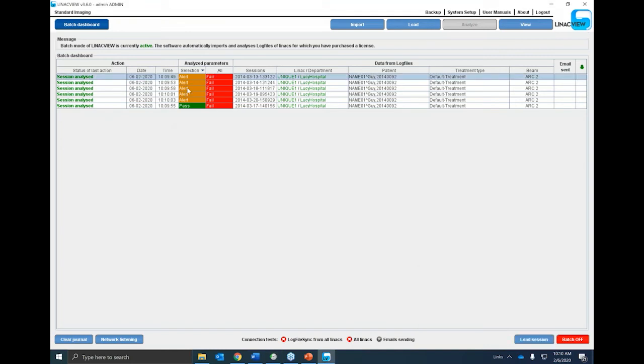You can see that because this is demo data, we had all failures, except for this one, because we want to have something to look at for the demo. But this is not a common occurrence in today's Linacs. You will rarely see a failure or an alert, depending on how you set your specifications for pass, alert, and fail.